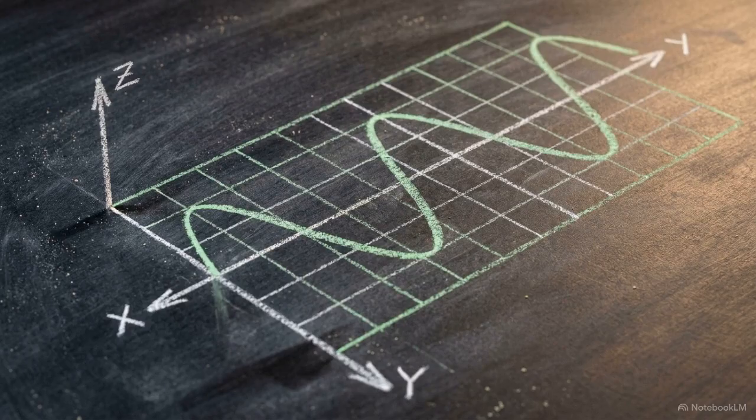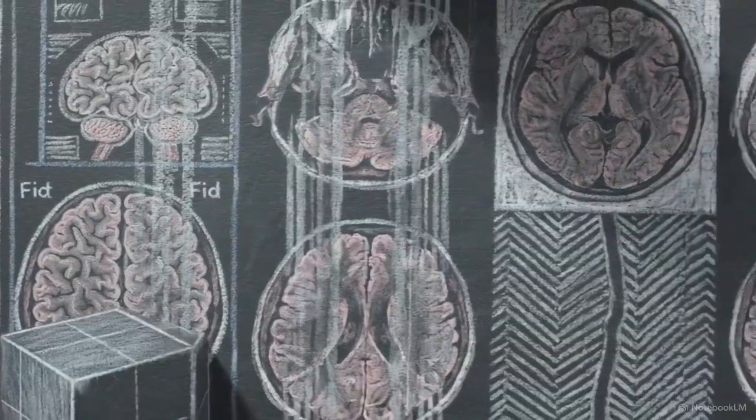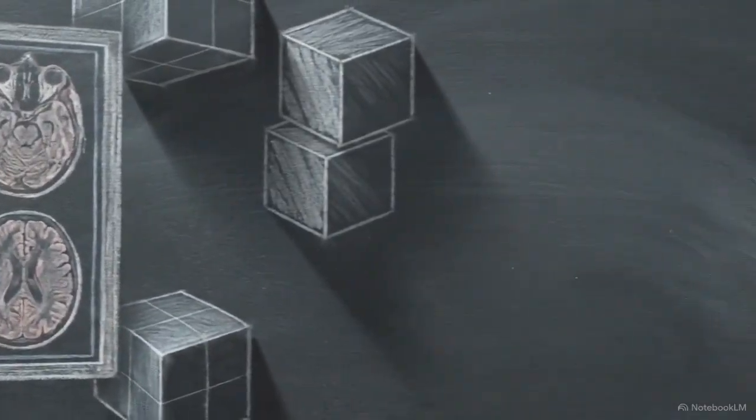Steady-state free precession imaging maintains a rapid, continuous signal, but it is acutely sensitive to the local magnetic field. Even minor inhomogeneities cause the stimulated echoes to constructively and destructively interfere, resulting in a distinct dark banding pattern across the image. Every attempt to bypass the temporal limits of the scanner exposes the baseline fragility of the magnetic field and the math interpreting it.